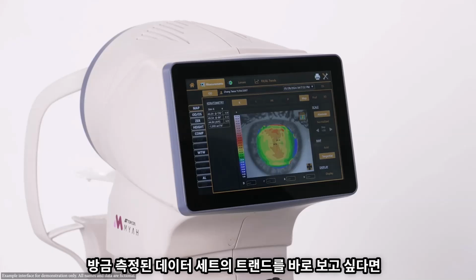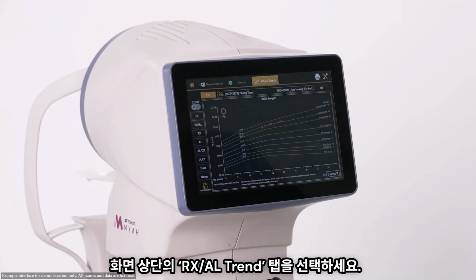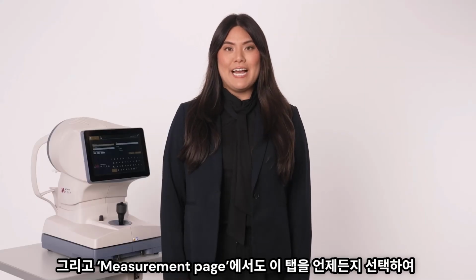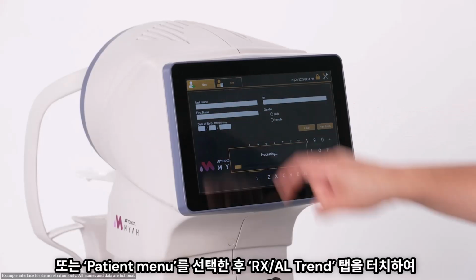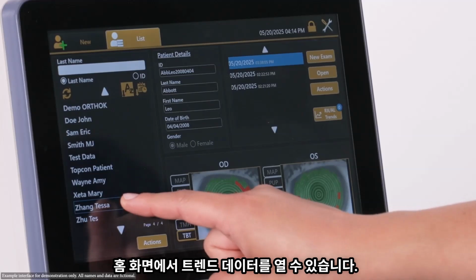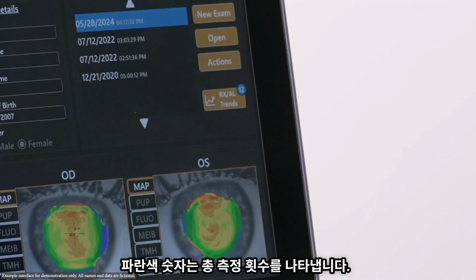If you have just captured a dataset and want to view data trends straight away, select the RxAL Trends tab at the top of the screen. You can also select this tab at any time from the Measurements page to view the trend data. Alternatively, you can access the trend data from the home screen after selecting your patient menu by touching the RxAL Trends tab. The number in blue indicates the total number of examinations.